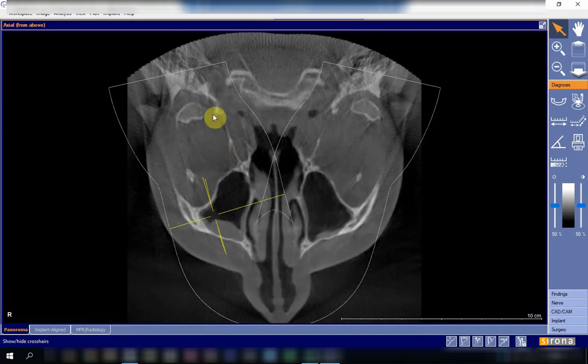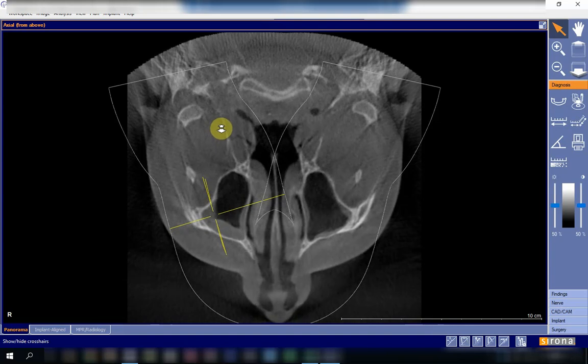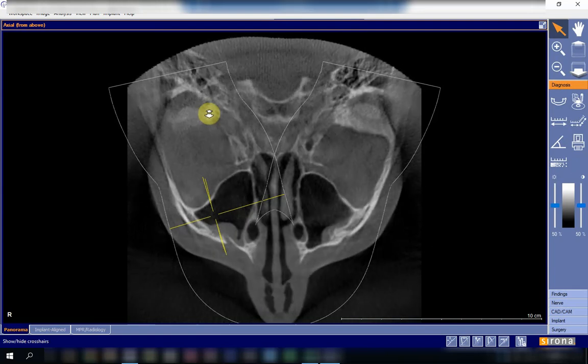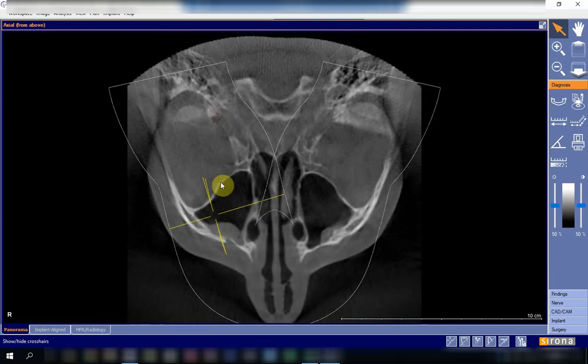naturally the condyle will be dragged in this direction, medially and more anteriorly. And typically the fracture site will be in here, over here. Okay, so this is the posterior process of the articular fossa. And it should again be just like with the condylar surface, all the same criteria, equal distances, homogeneous distances, no pitting, no erosions, no osteophytes. These are bony projections or bone spikes.